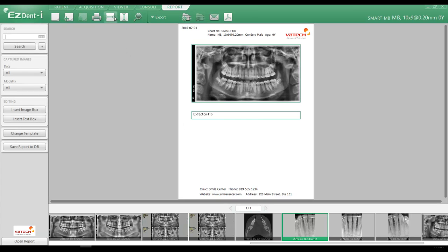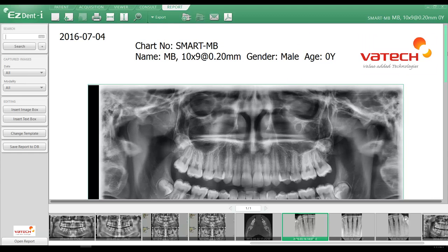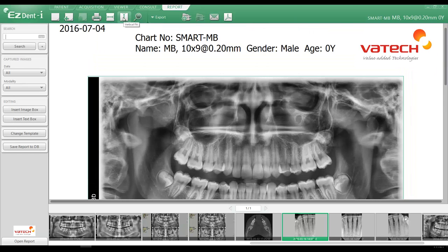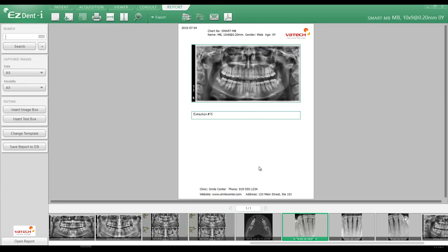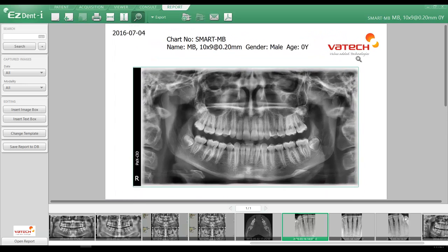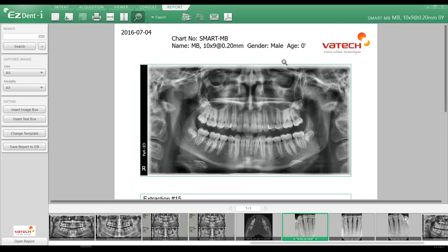We also have viewing options available as indicated in the toolbar at the top of the screen, such as fitting horizontally to fit across the screen and then scroll up and down to get to the top and bottom of our page, fit it vertically between the top and bottom border of our page, and we also have a zooming icon. We can left click and slide across the screen to change the size of our report area.